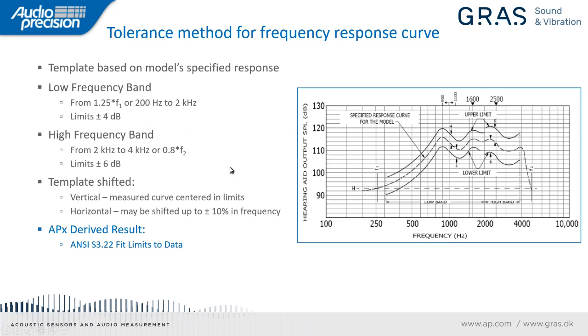Now, the way the standards are written, these limits are drawn on a transparent overlay, and you lay this overlay on top of the graph, and you're allowed to shift it vertically so that the measured curve is centered within the limits, but you're also allowed to shift it horizontally in frequency, up or down in frequency by up to 10% to allow the curve to fit in the limits.